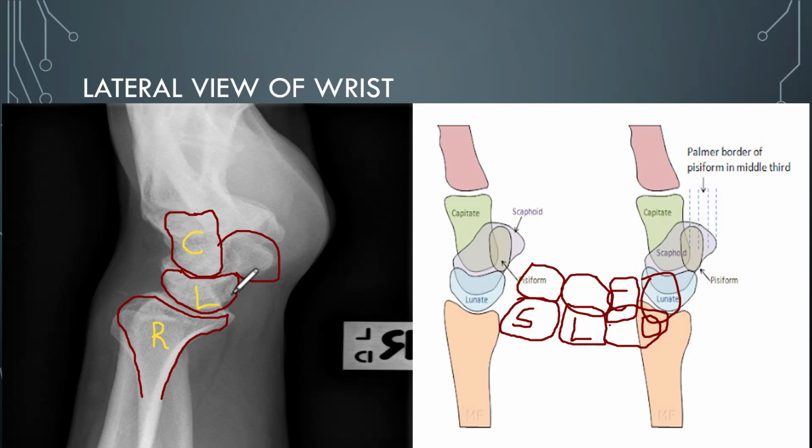Okay. So let's explain what we're trying to find out when we're looking at the lateral X-ray that we have over here, and you can always screenshot this later if you want. I'm just going to remove the drawings for now.